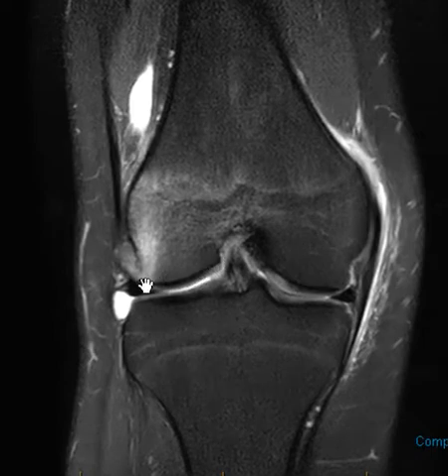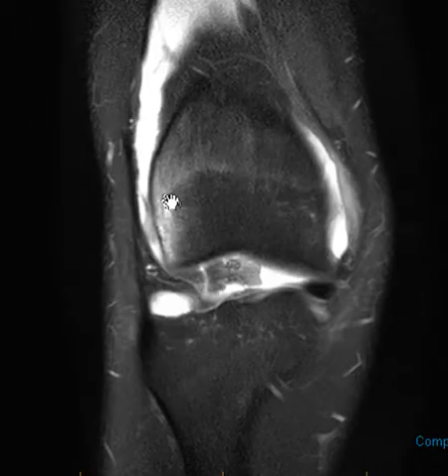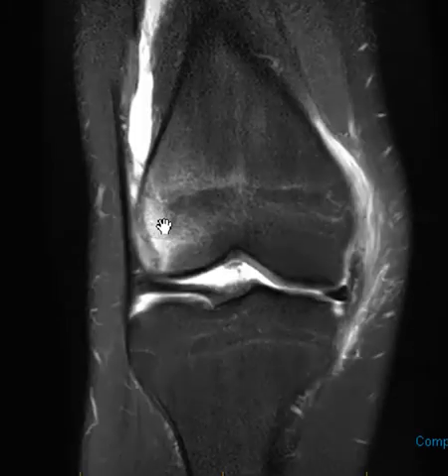This is the articular cortex, that black line. Here's the tibia, there's a meniscus, and there's that marrow edema. So it's above the joint line. We see it as we go forward. It's more anterior and above the joint line, and this is related to impaction with the kneecaps. This is a classic pattern of marrow edema.